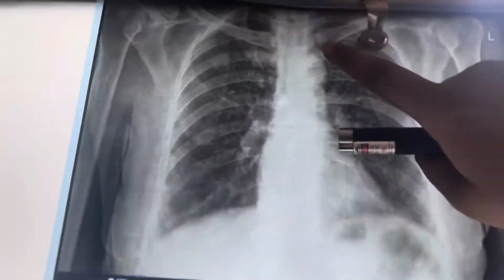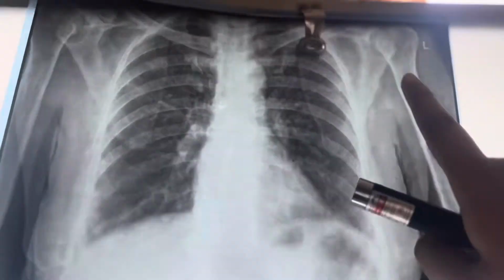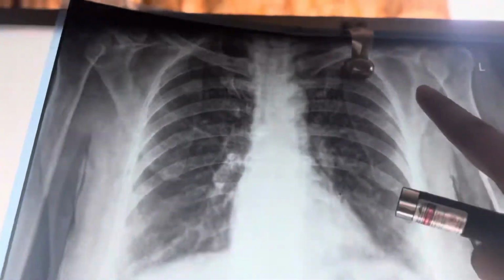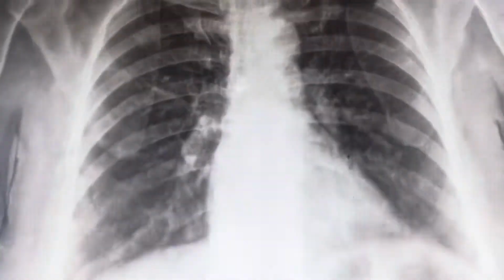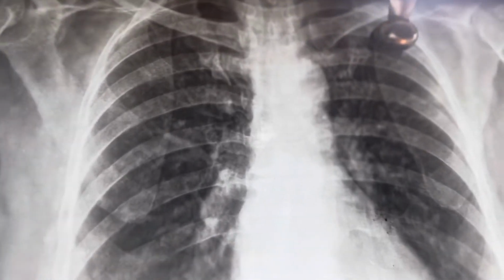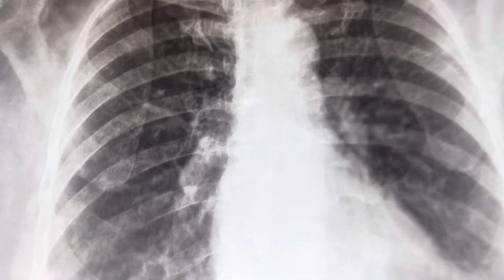So this is the posterior anterior view. Moreover, we can also identify the clavicle. This is the clavicle, the shadow of the scapula, the shadow of the humerus, scapula, clavicle, ribs. I already told you the aortic knuckle and the cardiac notch. One more thing, the hilum of the lung. In the hilum of the lung, we know that there are bronchial vessels, pulmonary vessels, and lymph nodes.